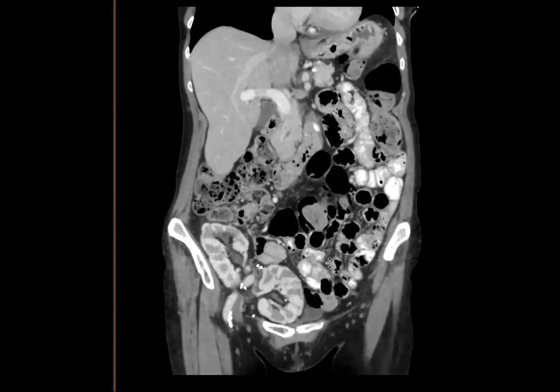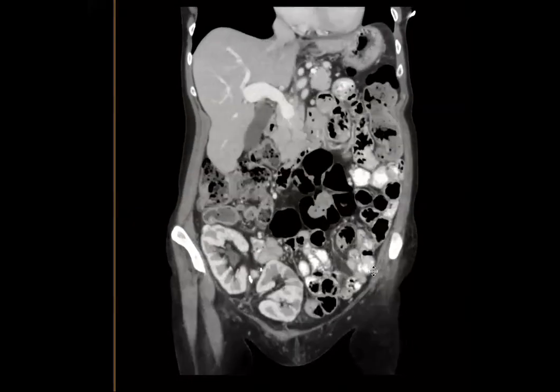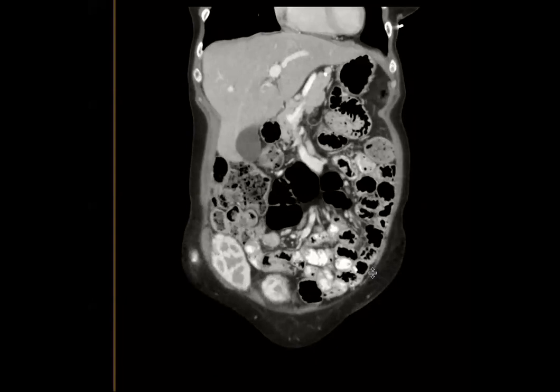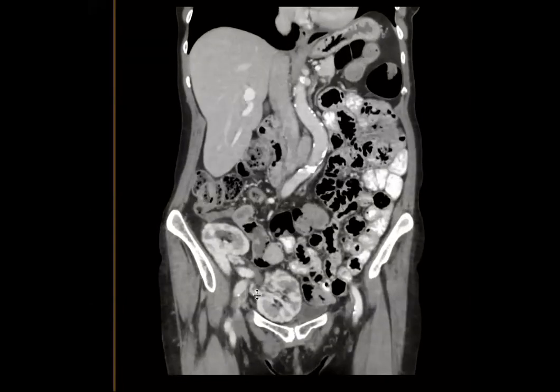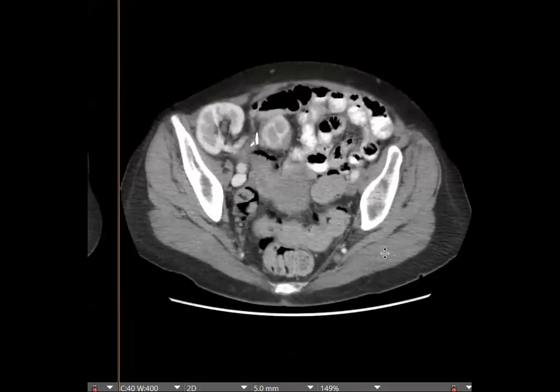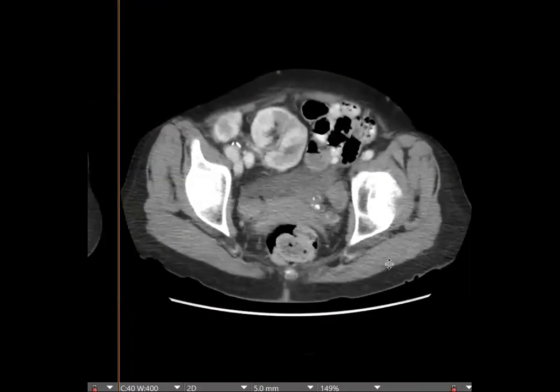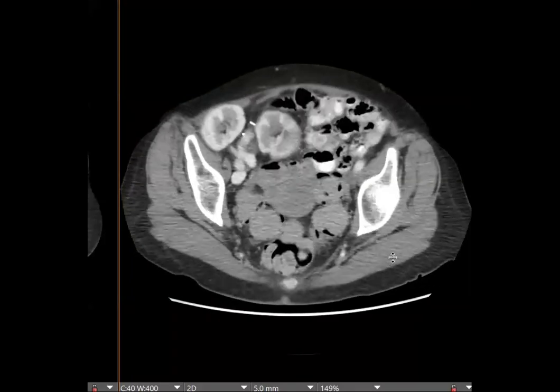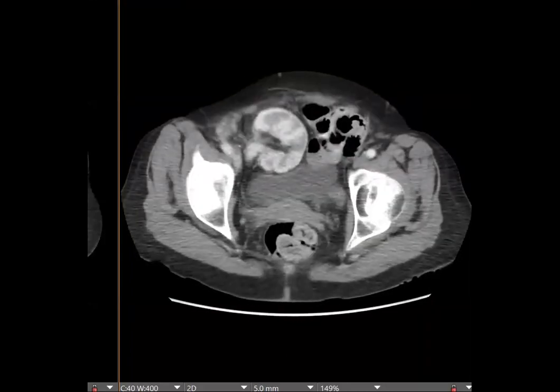One more point about the pediatric kidney thing is, can you scroll through? Often they will take both kidneys and the renal vessels and the aorta, and sew the pediatric aorta to the adult's external iliac vessel. It's kind of nice because you have an automatic, natural anastomosis between the two kidneys. Yeah. So here you can see it actually. Okay. Excellent. All right, let me stop sharing.